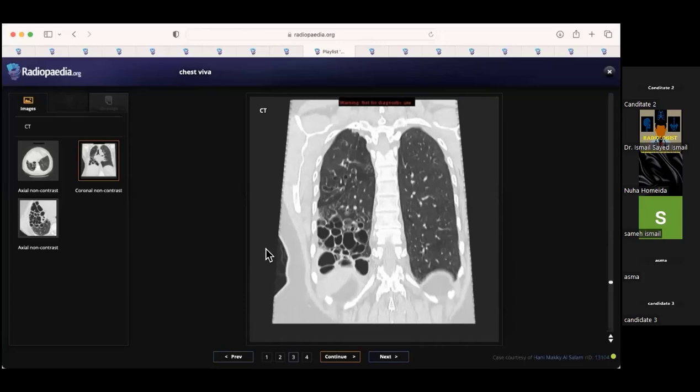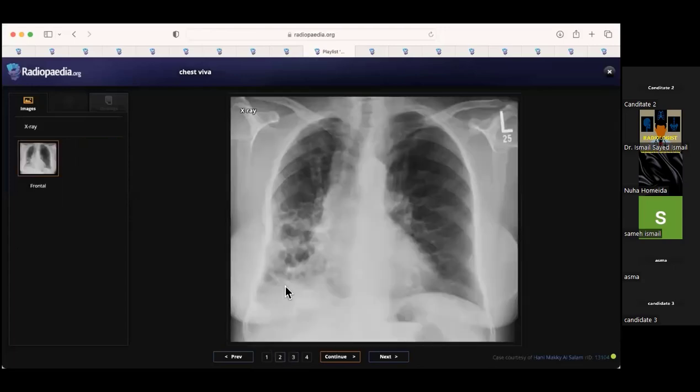So such as? Not sure. Okay, yeah. So well done. You've picked it up nicely. So this is just an extreme case of cystic bronchiectasis, and they appear quite rounded. It is confined to the right side, with some element of tracheal shift. So there is an element of collapse. So that's why the right heart border, we can't see it clearly.